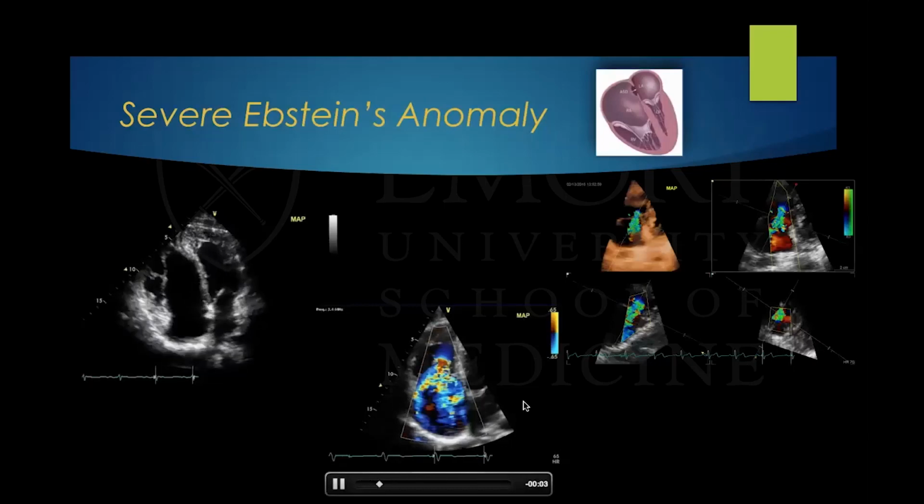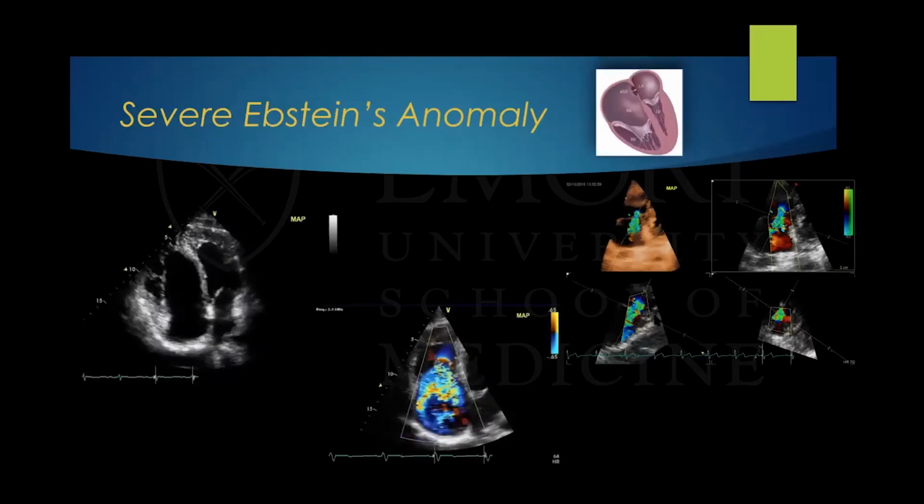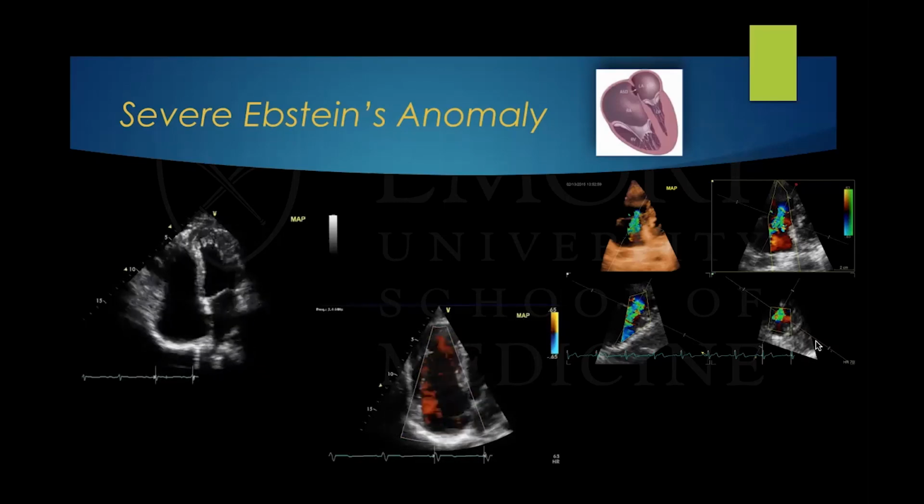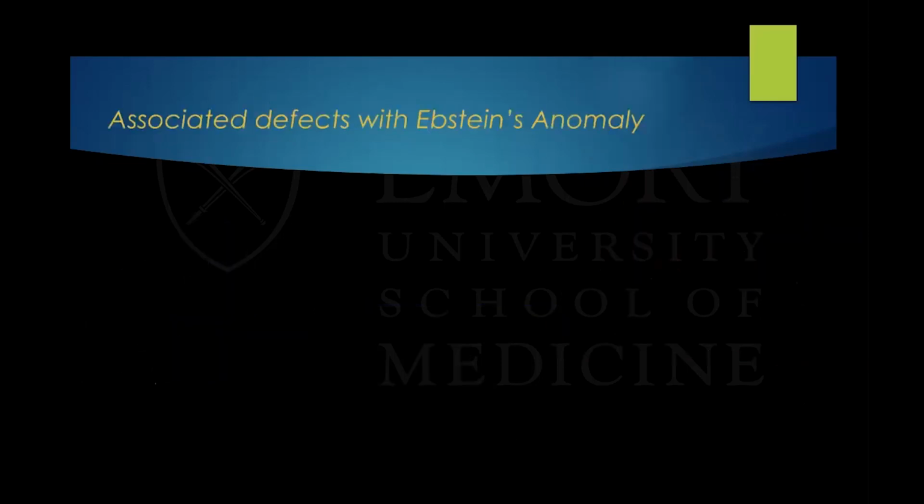And sometimes the tricuspid regurgitation is so eccentric that we need to utilize the 3D in order to see 3 planes of that tricuspid regurg and measure the vena contracta right at the plane, and the vena contracta will be the same as your effective regurgitant orifice.